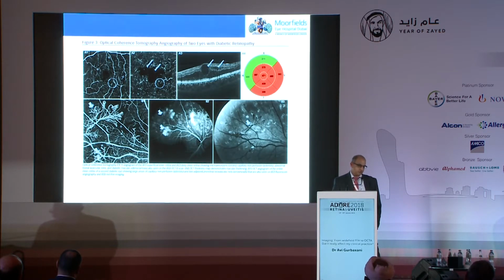You can see on OCT angiography the new vessels. The pattern of the new vessels is very obvious. You don't need to look for leakage, and so this can show you quite easily without being invasive.